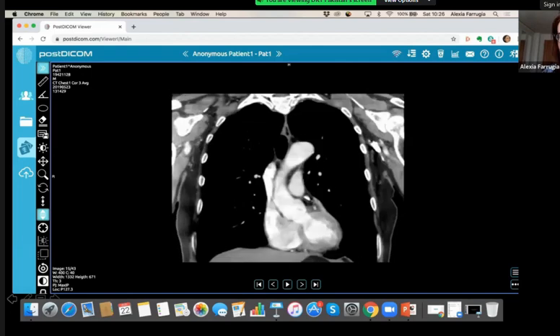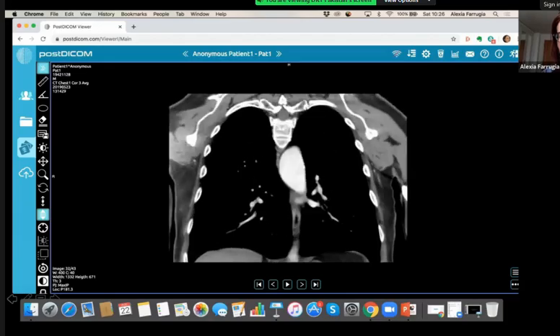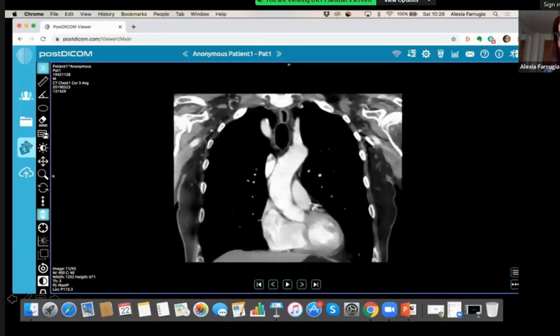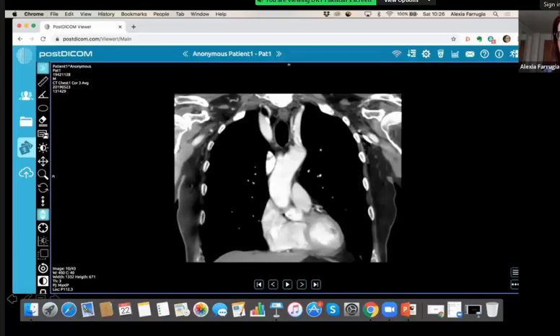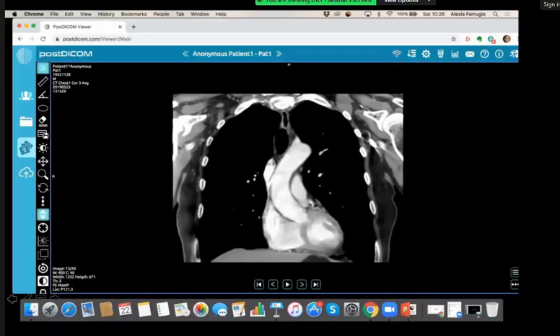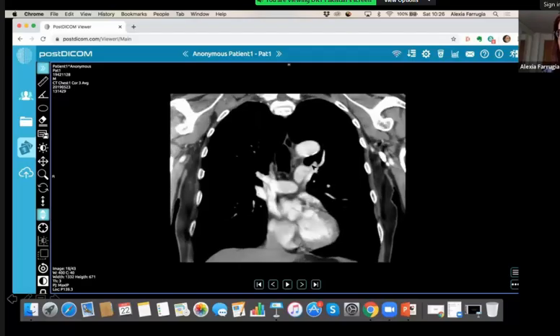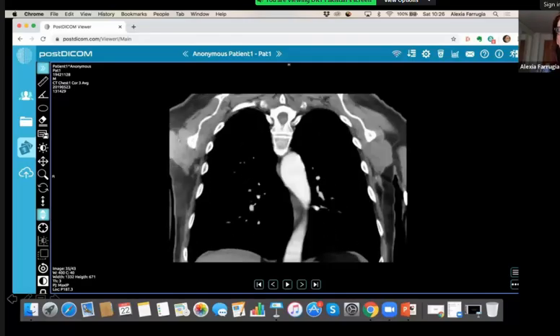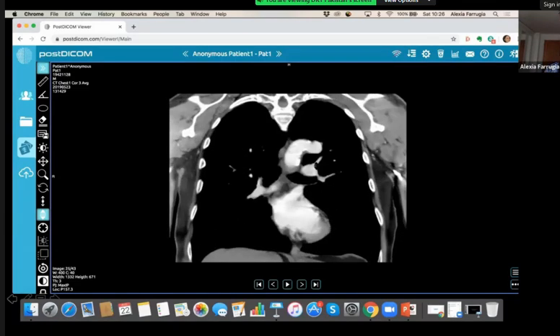Do you think it's a coarctation, or does it look like a coarctation to you? It doesn't look like a typical coarctation. No. In fact, it is a pseudo-coarctation. Right. It's a congenital anomaly. The important finding is that there's no hemodynamically significant stenosis across this area of kinking or buckling.